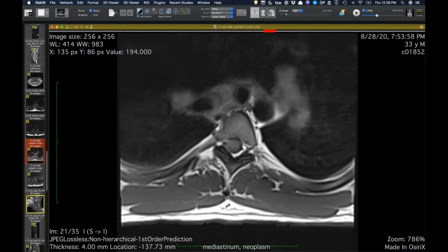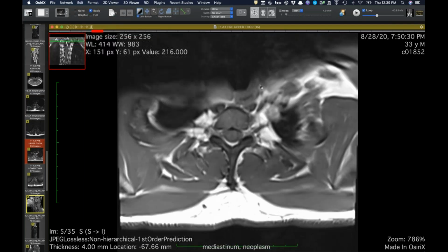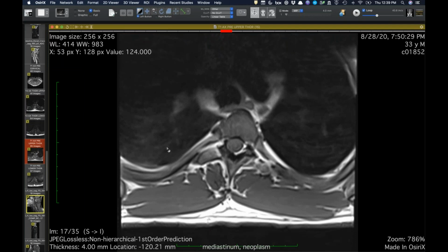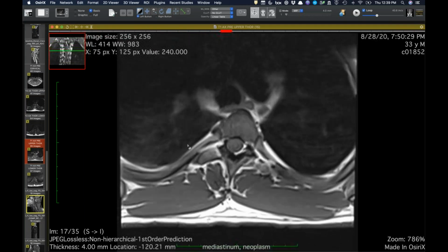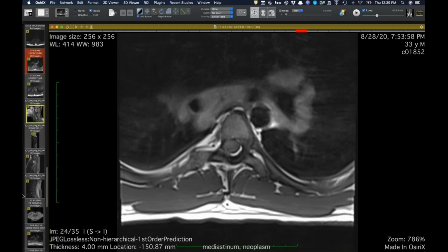but they also saw on this that the patient had lymphadenopathy, both supraclavicular and then in the chest, and so they were thinking this was probably a metastasis or maybe lymphoma. You may suspect where we're going with this though, because we're the ones that get to think of this diagnosis.